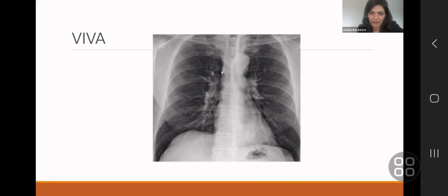When we were talking about the paratracheal stripe, I did say that that is actually the paratracheal stripe. When you want it thickened, you wanted this soft tissue density. What you are seeing here, I think some of you are getting confused with this haziness here, and some of you who routinely report chest X-rays would see how common this is. The way to differentiate that is, if you think this is a paratracheal stripe, then what is this? This actually is a paratracheal stripe, and this is 2 to 3 millimeter with a normal image.